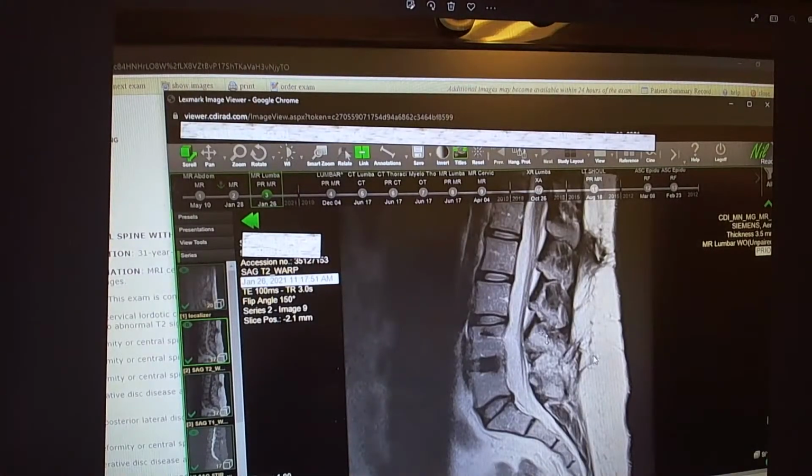So here, let's look at this one. This is as well an MRI of the T2, and you see that something is done here. Who can describe what is done here? This doesn't look like the rest of the spine. There's a dark space here. In the T2, we know that the dark space means less water. Less water means that possibly this is not a biological tissue.